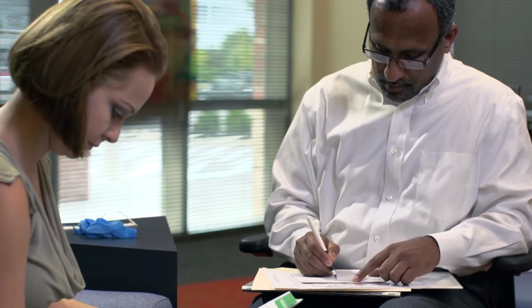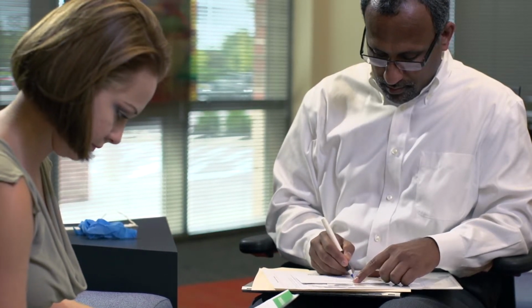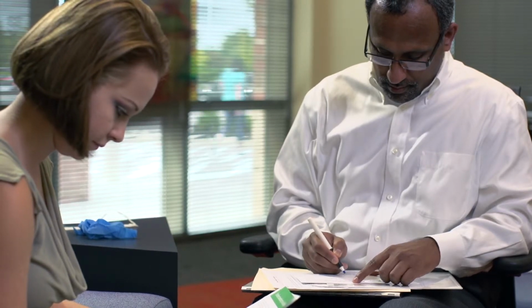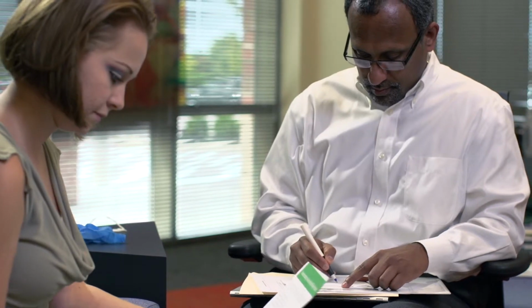For facilities in the state of New York, an additional form, GeneSight New York Patient Informed Consent, will be included. Next, label the sample envelope by writing the patient's name and date of birth, as well as the collection date and the collector's initials. This is essential to the chain of custody, and if you do not complete all fields, it could delay the processing of the patient's sample.